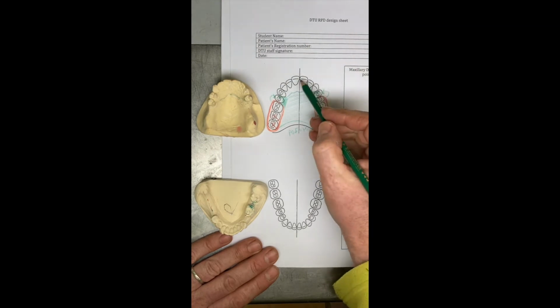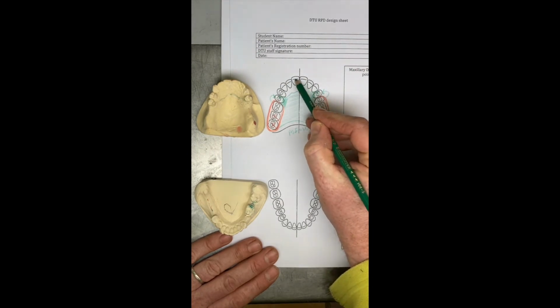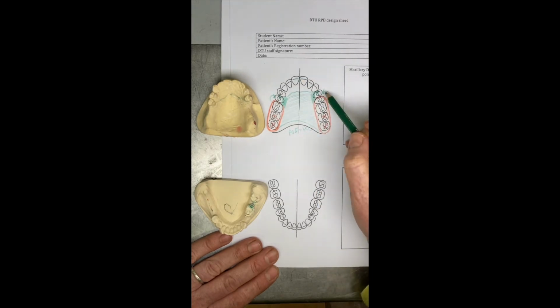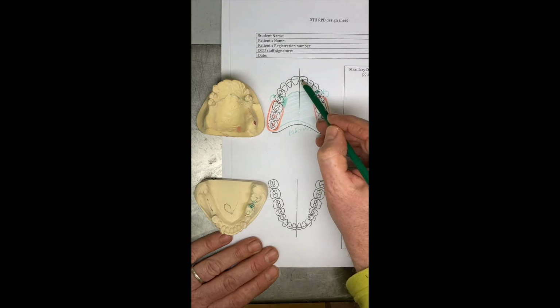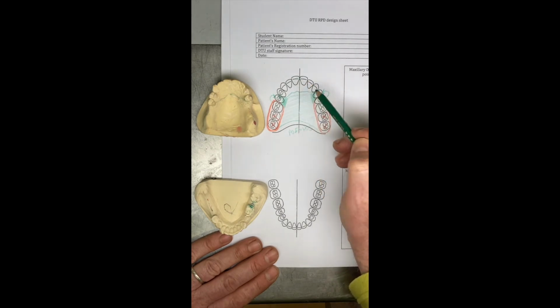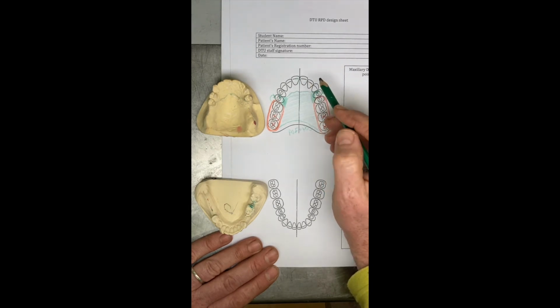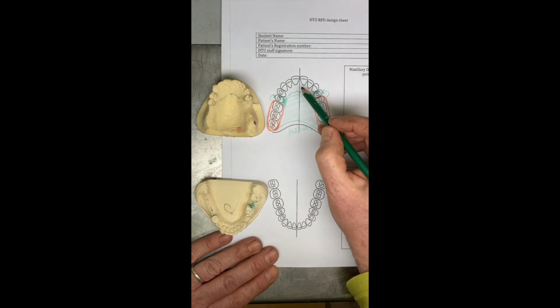So from a mechanical point of view, the ideal place for our indirect retention would be an incisal rest here on the hard tooth surface. Not very aesthetic, not very nice for the tongue, can affect the speech, all that kind of stuff. So we could come back just onto the cingulum of these central incisors. That would be doable. Just need to bear in mind where the lower incisors are occluding and check if these cingulum rests would be interfering with ICP and so on.